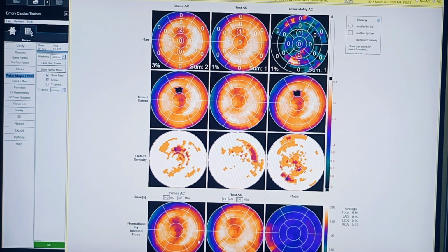Right, that is fine now. And if all is coming blue, ratio means it should be the same, right? Like 3/3 should be 1. It should be near to 1, exactly. So it has to be blue areas. That means there is no difference between stress and rest.